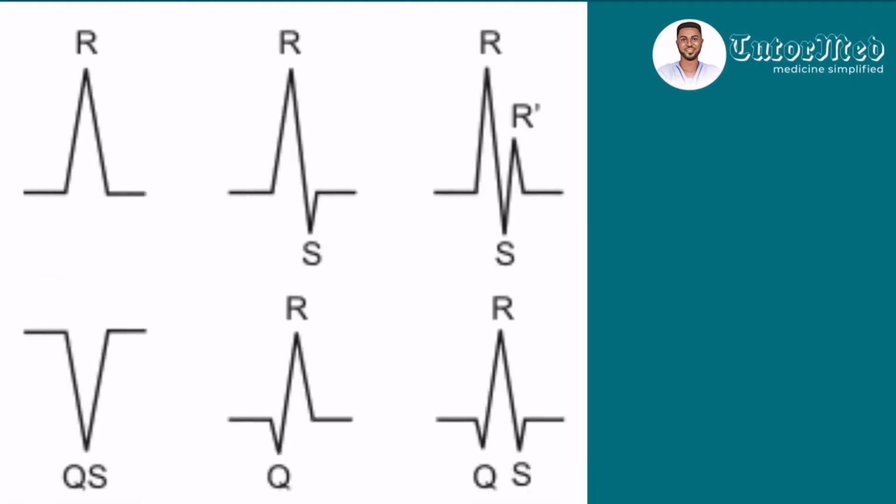Very good. So let's cool off here by practicing some of the principles we've discussed. Let's take some time to understand these various QRS complexes. The first one only has one wave, and that wave is an R wave. Why is it an R wave? Because it is the positive wave in that complex. Remember that we said although some QRS complexes in some leads will not have all the three waves, even if it is one, we still conventionally refer to that wave as a QRS complex. Let's move on to the next one.